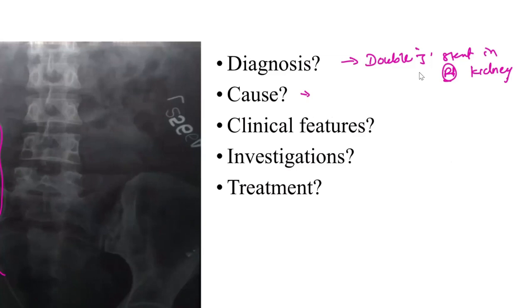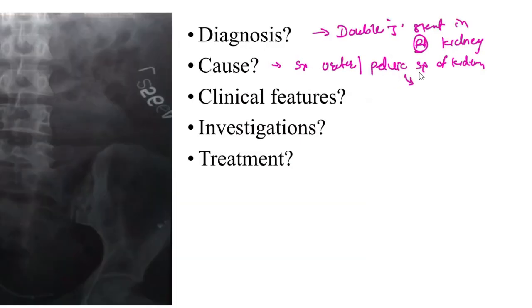It is placed after the surgeries of the ureter or bladder or pelvic surgeries of the kidney, or for the drainage of hydronephrosis.